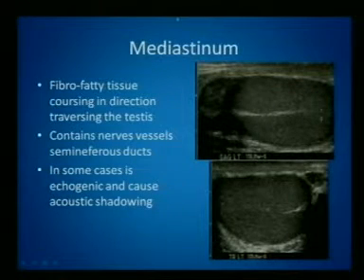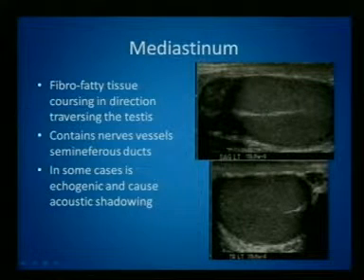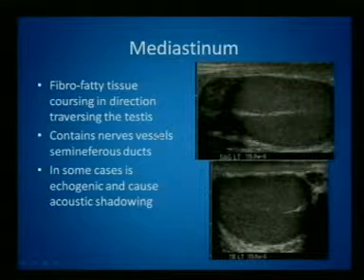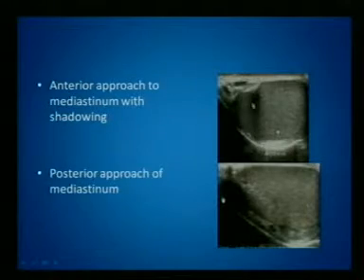Also, the mediastinum of the testis can sometimes give a false impression. The mediastinum of the testis is fibrofatty tissue that directs the long axis of the testis, and contains vessels and seminiferous ducts, and sometimes it will give some shadowing.